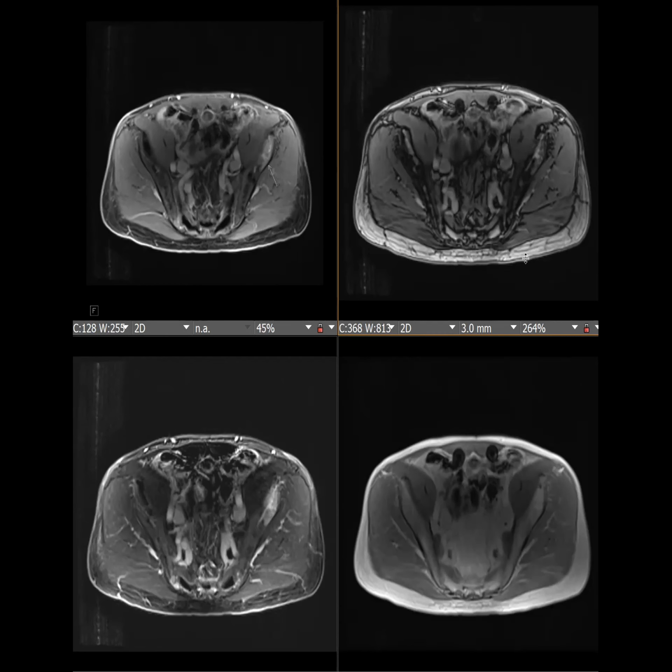But when we put ROIs on in- and out-of-phase gradient echo images, the lesion did have intralesional lipid, and fat in an osseous lesion is benign, and this was a hemangioma. That's how we classified it on this prostate MRI. And this actually was concordant with the patient's known clinical parameters.